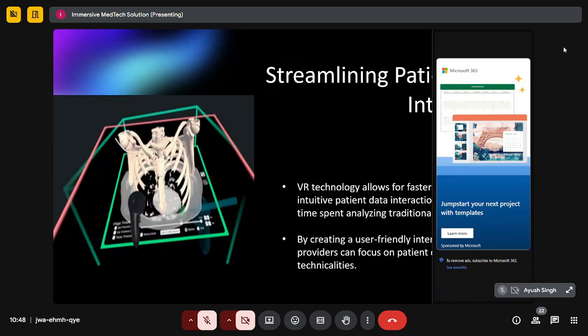A normal surface mesh can also be created in Elucis itself, wherein we can define the node sets. We can also define the shells that are required.